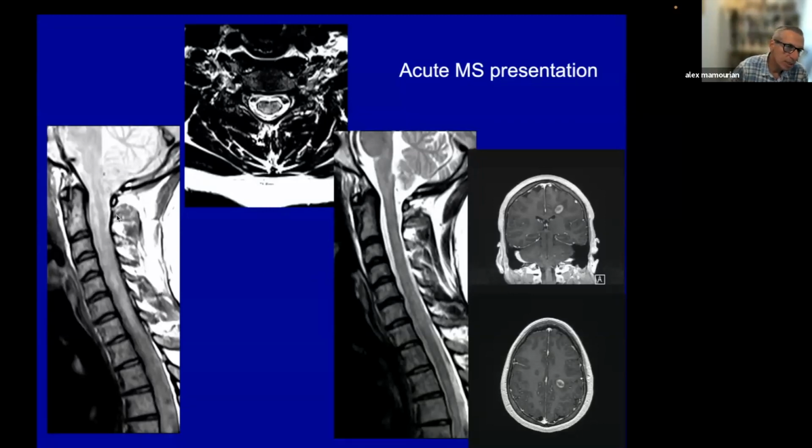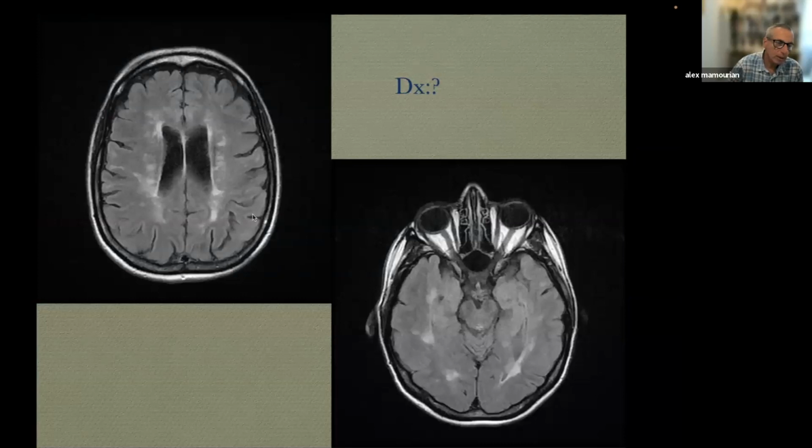Now, in this image, this is a proton density image. Now, again, the downside of proton density image is that we see that the CSF and the spinal cord are similar in signal. But again, we're not looking for the contour of the spinal cord, which you can see well on the T2 weighted scan. We're looking for intrinsic signal abnormalities in the spinal cord. And so this proves to be a real lesion that is better demonstrated on the proton density. So in terms of protocoling these patients, I think you should incorporate one of the more advanced techniques with inversion recovery or proton density when you're looking for lesions in the spinal cord. But of course, FLAIR imaging is very helpful in looking in the periventricular region.